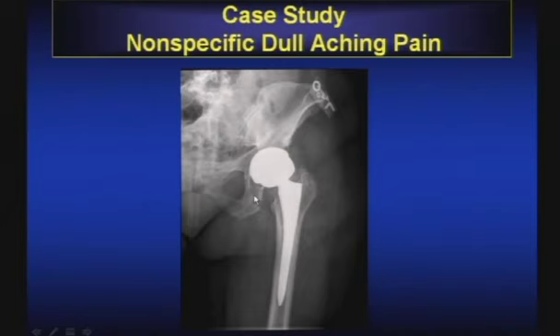So here's a case study of the next thing that we're going to discuss and the final of our time together, metallosis, or the complication of the metal-on-metal total hip replacement. These patients, again, scary, present with dull, aching pain. Not too bad, maybe so slight that they may barely want to mention it to their orthopedic surgeon on follow-up. So very vague, right?